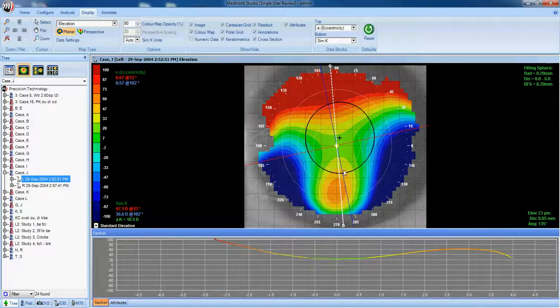This is a high point on the cornea. This point here is also a high point on the cornea in relationship to the spherical surface. However, horizontally, we can see by these blue areas we have a low point in corneal elevation. If we were to drop a rigid lens on this eye, it would lift at 3 and 9 o'clock. It would bear at 12 and 6 o'clock.